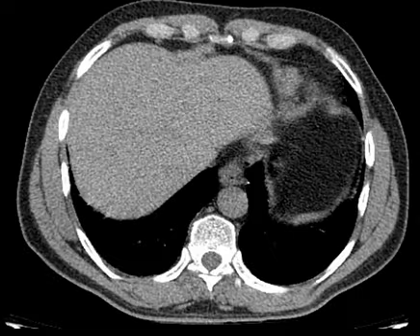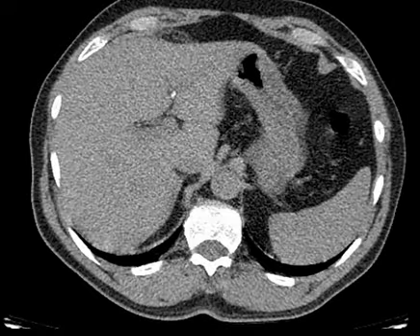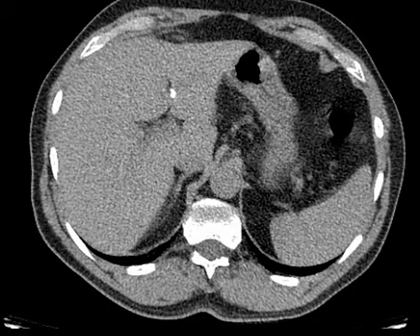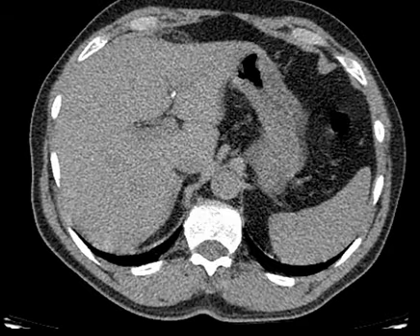Let's scroll the CT, and when we are scrolling the CT, we can see a hypodensity in the left lobe of liver. It was of cystic density, fluid attenuation, so it's likely a small cyst, although very ill defined. When we scroll downwards, we see a calcification along the falciform ligament. This is another finding, but it does not explain the cause of the pain.